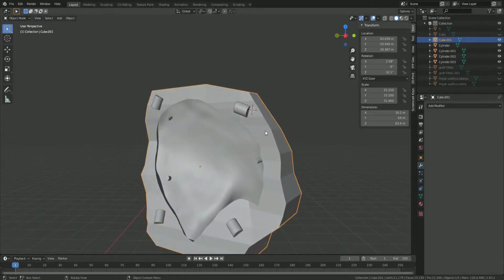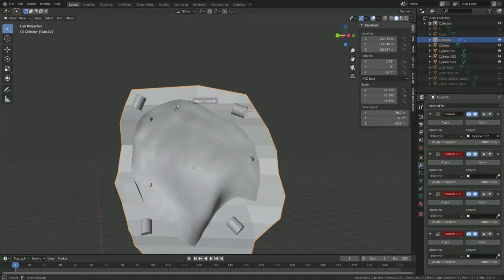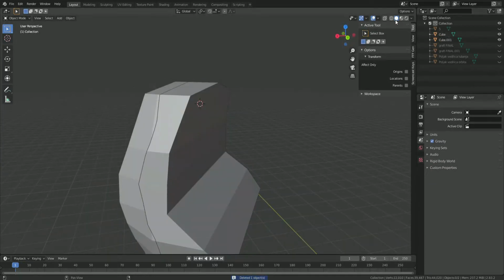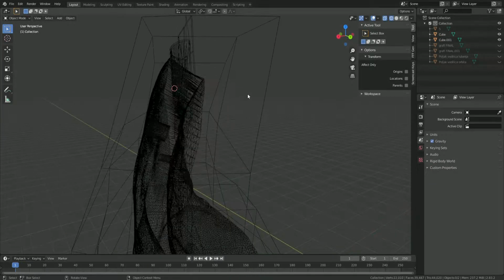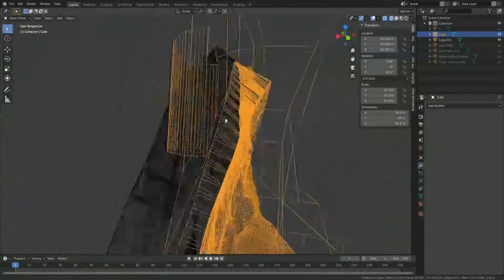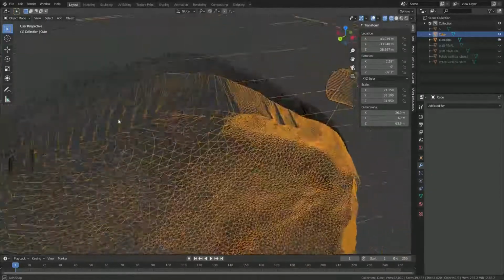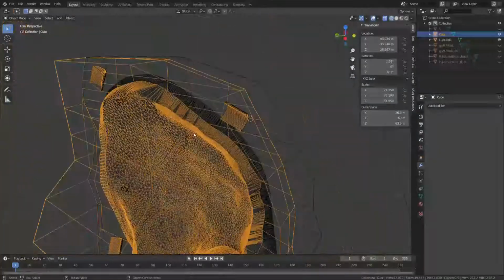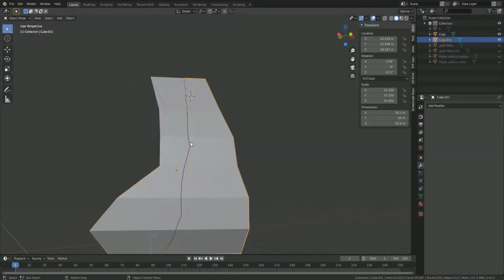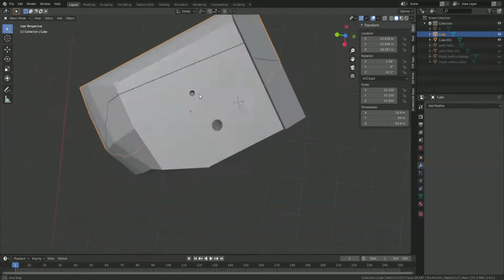Okay, so what you want to do is, so this is the result. You see, if I choose one, these points will help place these two parts, and I'm planning that we will have some kind of clamps holding together these two parts.